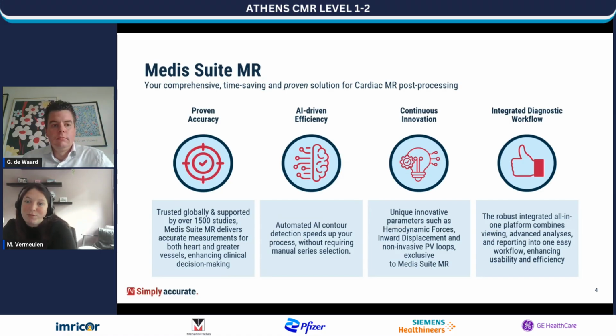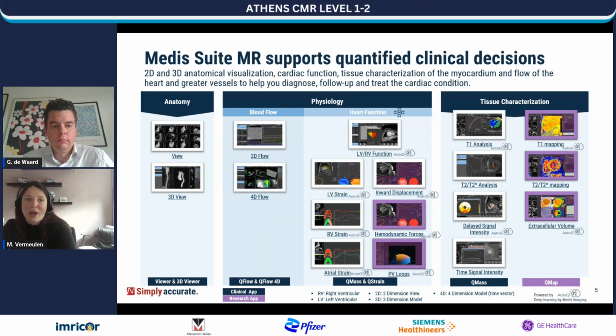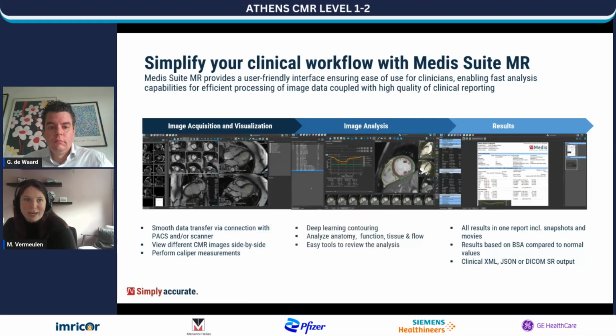And all of this is available, like I said, in one platform, in one product, which can be well integrated into your hospital environment. Here is just a quick overview. I will not go into detail into all of these modules, but just to give you an overview of all the modules that you can process with the Medis MR software. As you can see, it's quite an extensive tool set.